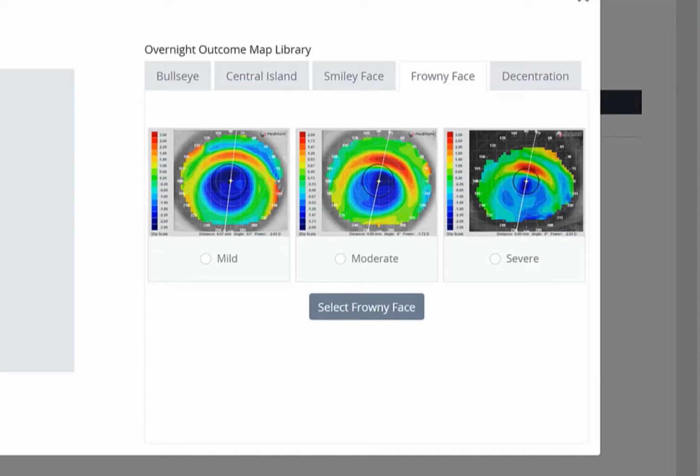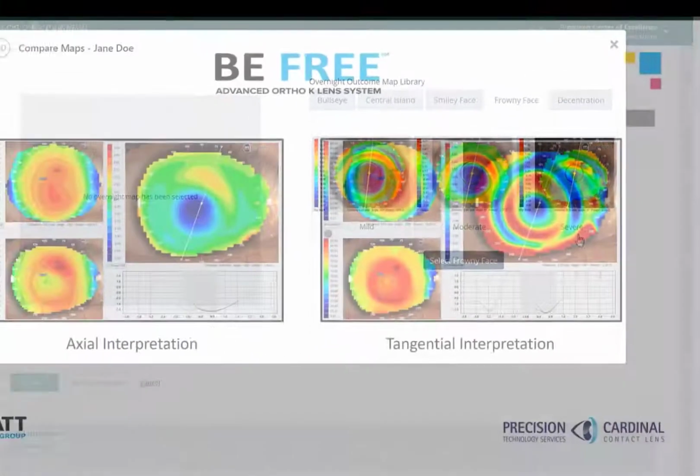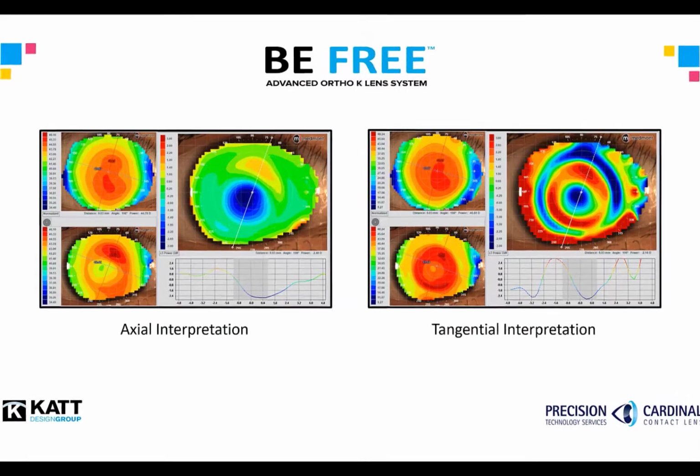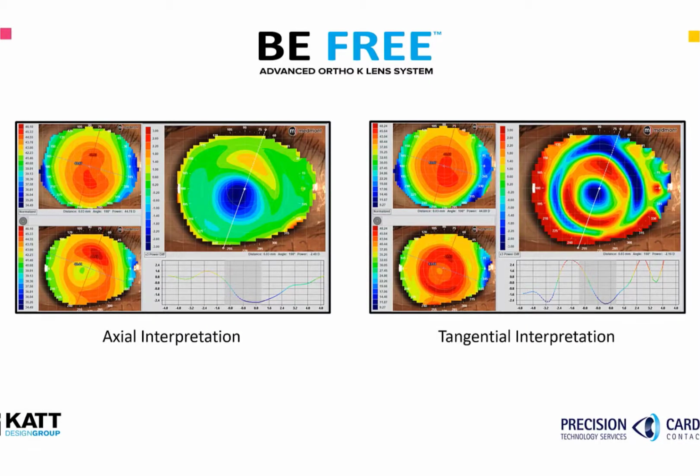Next, we need to determine the severity of response. Was it a mild, moderate, or severe? When we review our topographies again, we wouldn't say this is mild inferior displacement. It's not a mild frowny face. It's definitely a moderate. It could possibly be a severe response.